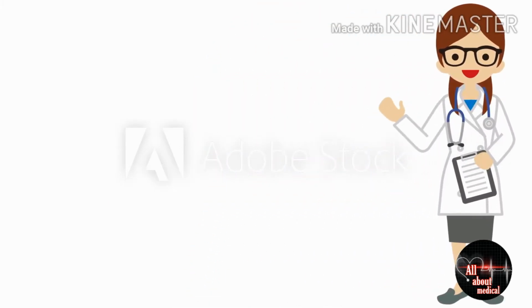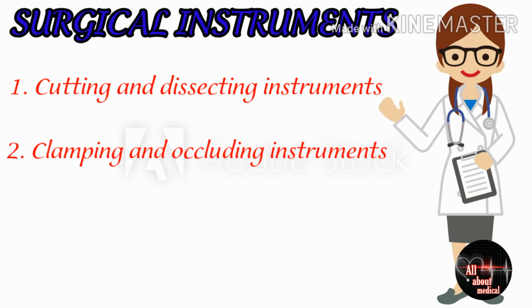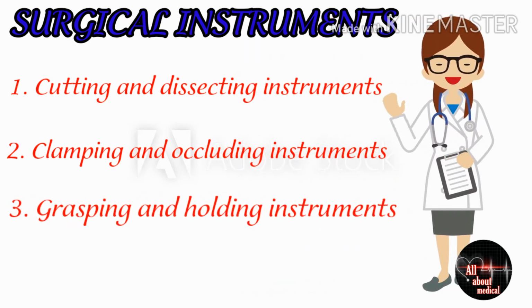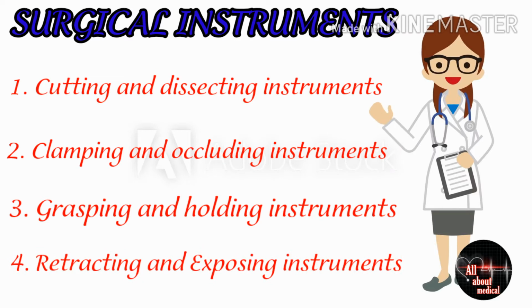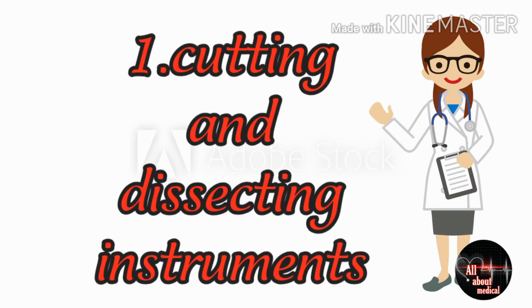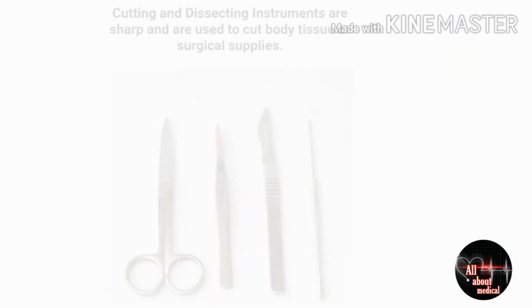We will discuss all surgical instruments mainly in four categories. First category is cutting and dissecting instruments, second is clamping and occluding instruments. Third category is grasping and holding instruments, and the fourth category is retracting and exposing instruments. So let's start with our first category, which is cutting and dissecting instruments.